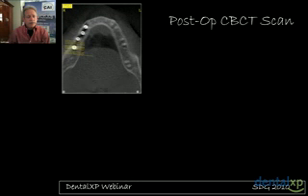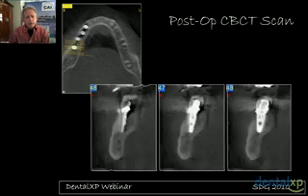And so here's, I think, probably the most impressive to me. This is the fourth implant, the one that we placed in grafted bone a year and a half later. And so when we take a look at this implant and this placement and this accuracy based upon placing a tapered implant, look at this zone right here. We've missed perforating, fortunately, because that's exactly as we had planned it. But look at the amount of bone that we've regenerated around this implant.